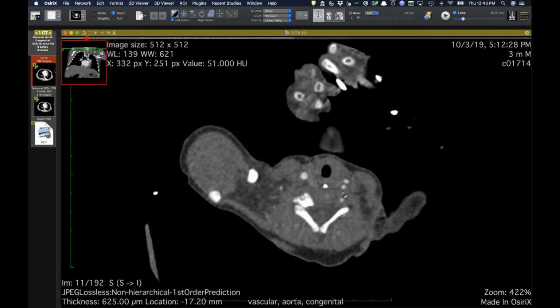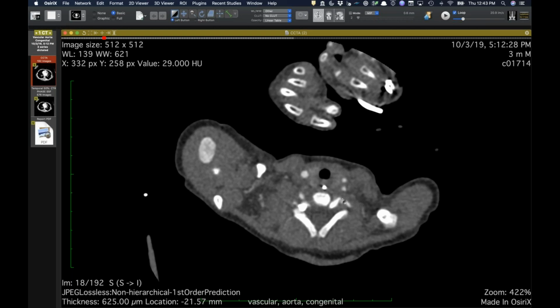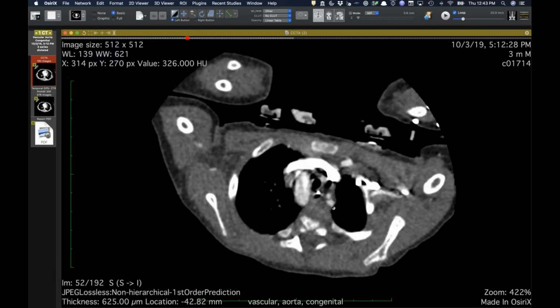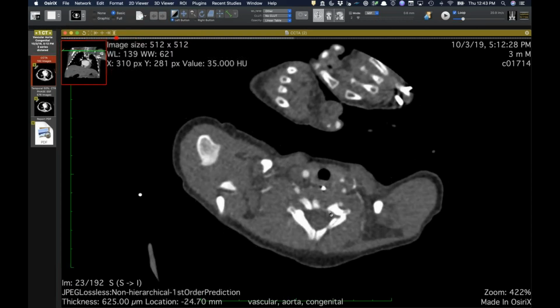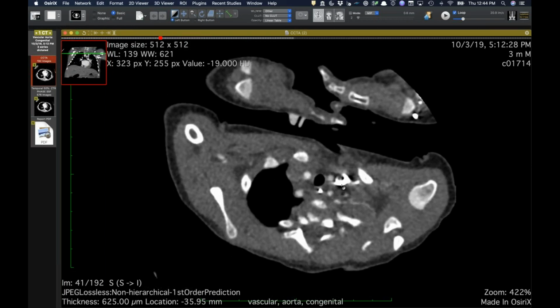And there's no vertebral artery component to these vessels that you're seeing. No, I think the vertebral artery's here, and it's coming off the subclavian, as you would expect. Right. Yeah, and I think it's a double arch, just given the symmetry. If you scroll up toward the top, you've got this very nice symmetry of vessels.